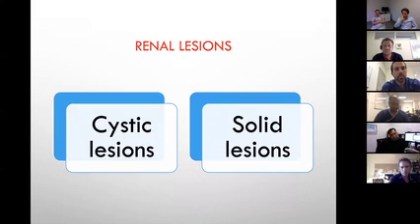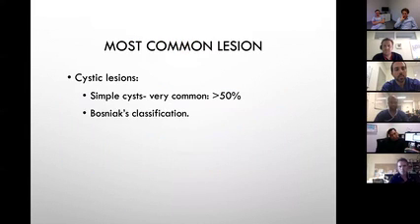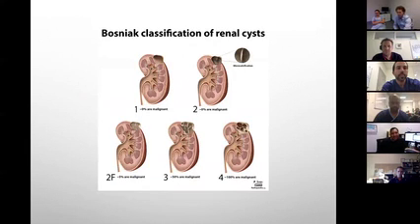All right, cystic lesions, solid lesions, and it's a long way, man. The common lesions that you see are all cysts. That's the common stuff you see. All you need to remember is just this one classification. That's probably the complicated factor of the whole kidney disease. So that's this. It's called the Bosniak classification. This is what's universally been used for any cyst.